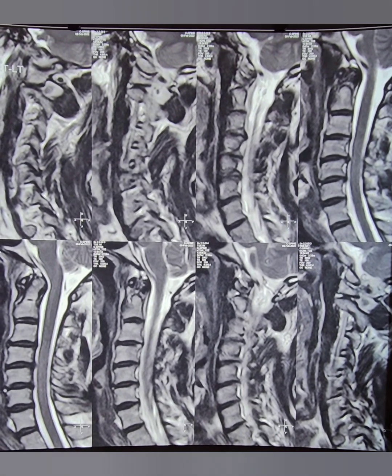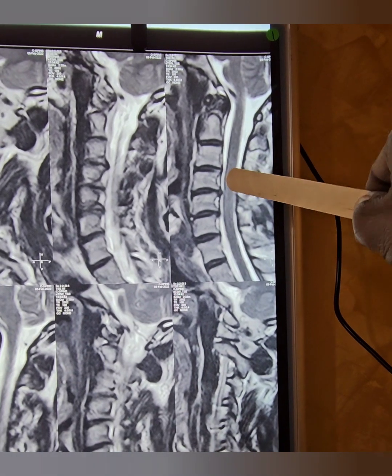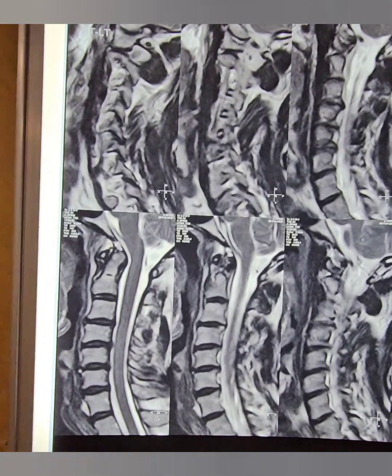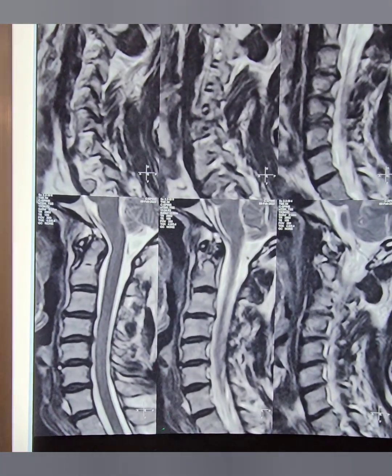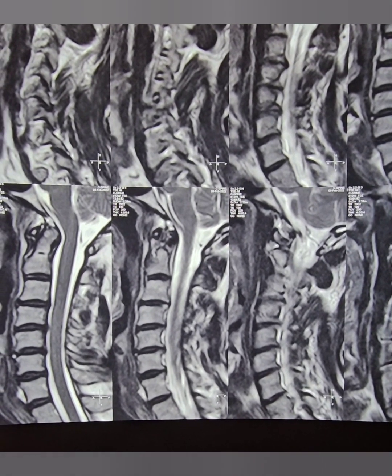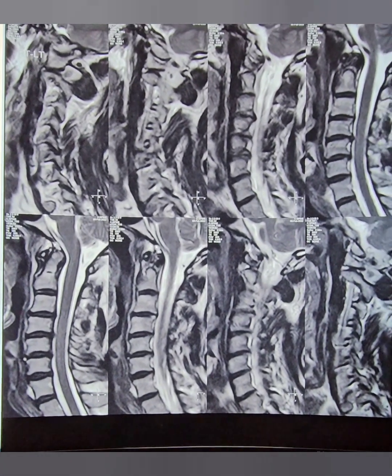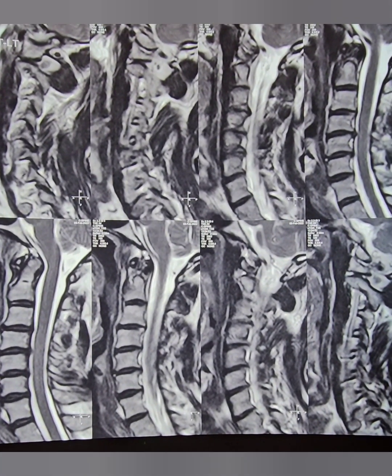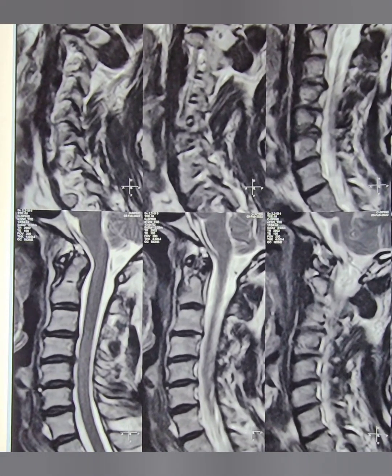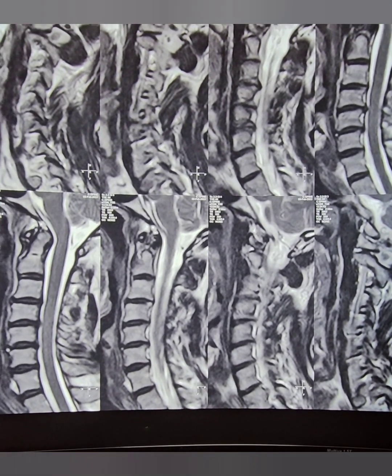Here is the same patient's sagittal view. You can very well see the disc bulges in the sagittal view. But what you can see in this view is that all the bulges are happening posteriorly. Whether it's happening on the right side or left side, you can't make out so clearly, unlike in the axial view. So that's how you have to compare the sagittal view along with the axial view to know whether it's a central bulge, a paracentral bulge or a foraminal bulge. Accordingly, you can make a clinical decision, as well as decide whether the patient needs surgery or can try physiotherapy, based on the radiological finding.